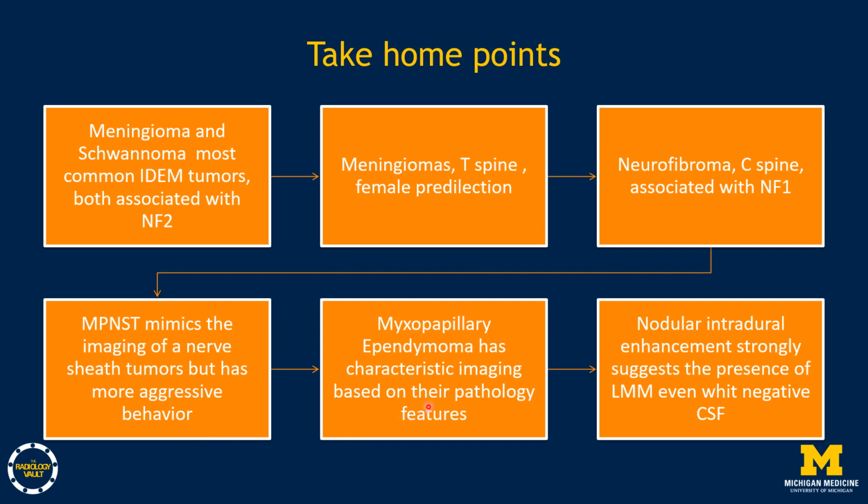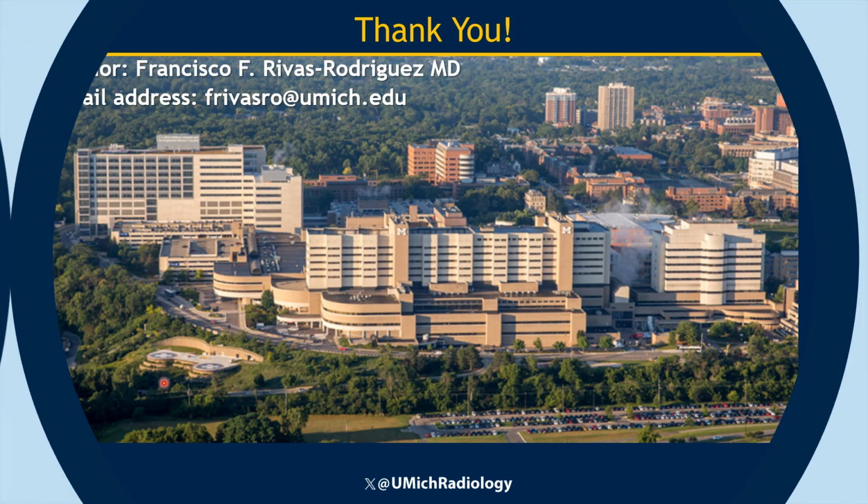Myxopapillary ependymomas have characteristic imaging features based on the pathology, and nodular intradural enhancement in the setting of a known primary strongly supports the presence of leptomeningeal metastasis, even in the face of a negative CSF cytology.